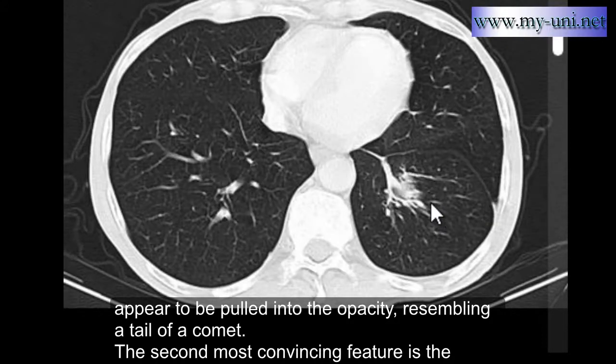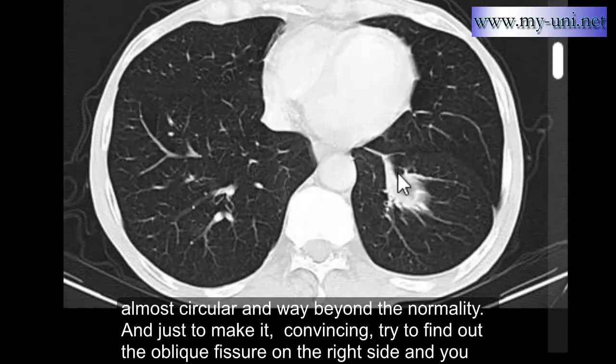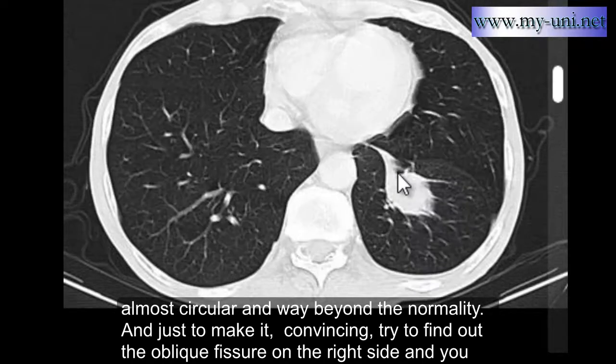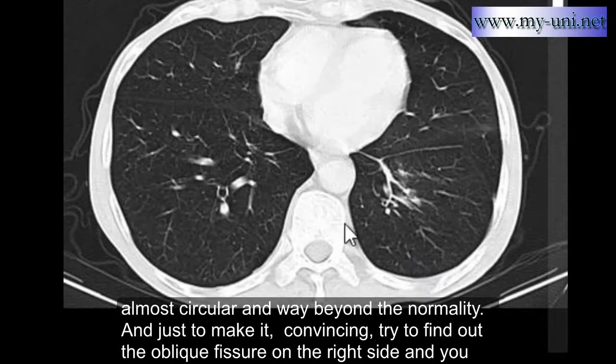The second most convincing feature is the curvilinearity of oblique fissure on left side. Although you'll occasionally see slight bending of fissure in normal subjects, this is almost circular and is way beyond the normality. And just to make it convincing, try to find out the oblique fissure on the other side. So this is the oblique fissure on right side.